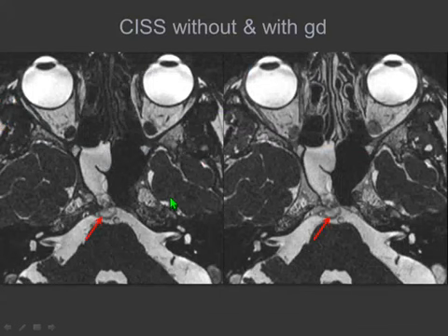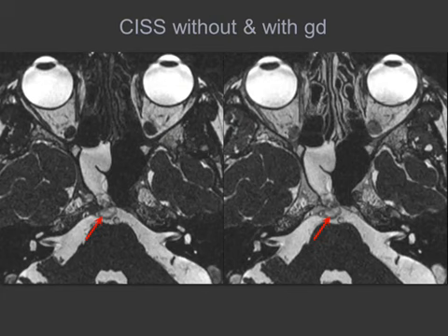And what to do in this case? Of course, it is MRI. Well, this is a special solution for MRI. As you can see, it is cisternography. In this cisternography, though you have a very high signal coming from the cistern, you also have some influence from T1. Therefore, before and after contrast agent, you will see that the vascular plexus located around the Dorello canal, where you see the sixth nerve, will enhance on one side.